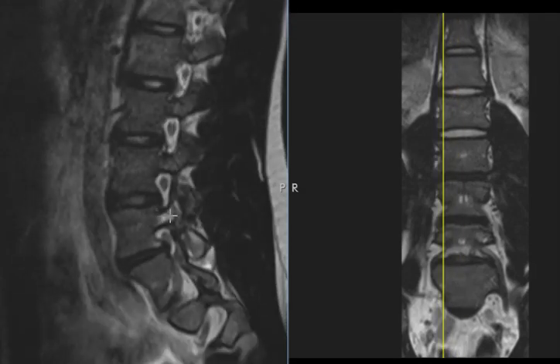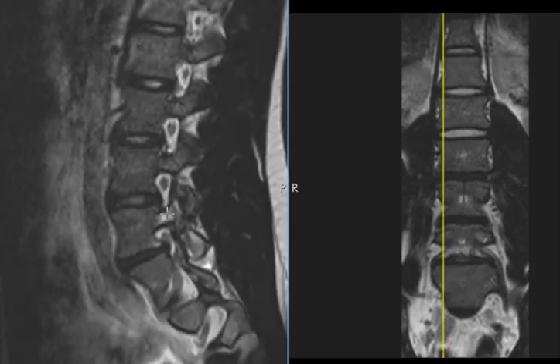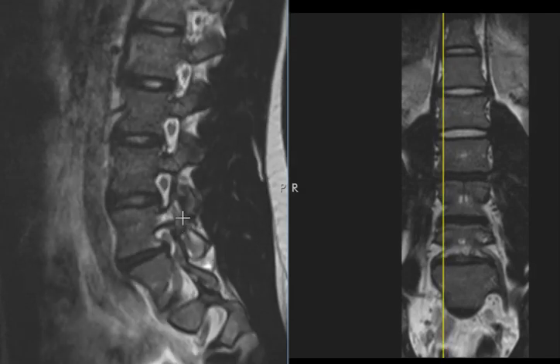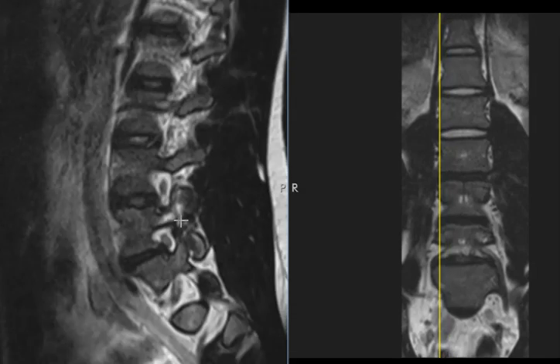And this is called the pedicle, and this is called the pars interarticularis. And this is a facet joint from the top coming down. This is a facet coming up to the top facet joint. And this patient has marrow edema, indicating that there's a stress injury. And if we look right here, there's a vertical line here. This is a fracture. This patient has a fracture of their pars interarticularis, or we call it a pars defect or pars fracture. This is on the right side.